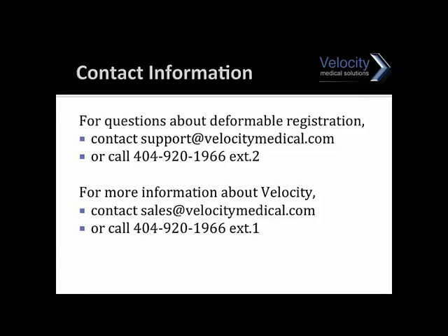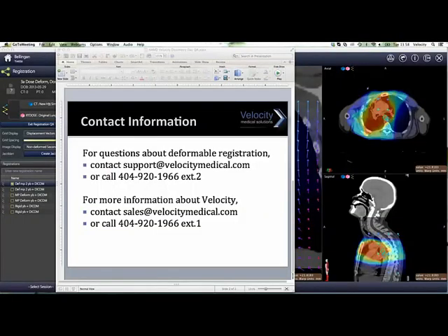A question, someone asking if this was available in 281. No, the warp map is available in 281, but in the newest release of Velocity, we've brought in a QA tool specific to do the QA of the registrations.